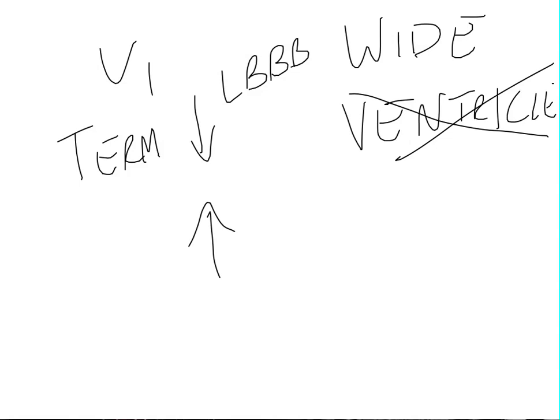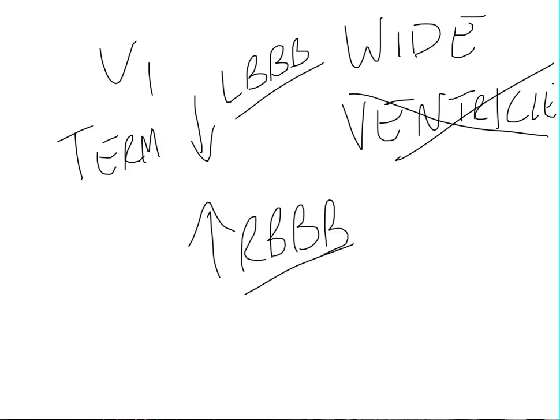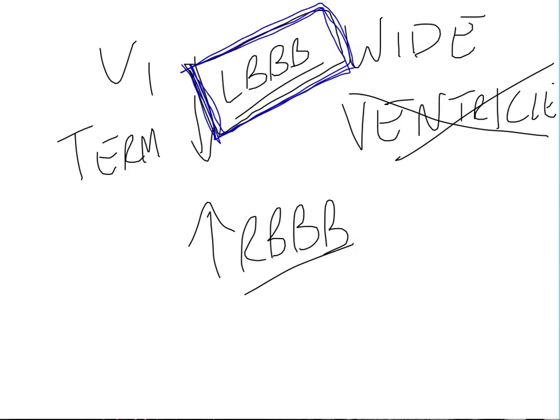Okay? Why is that important? Well, most EMS agencies do not let you identify STEMI with a left bundle branch block, because with a left bundle branch block, you get ST elevation normally. Okay? With a right bundle branch block, you typically don't, because of something called T-wave discordance.